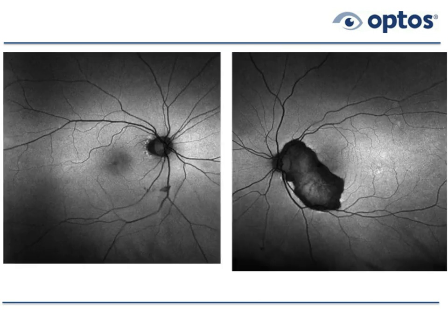Comparing the right and left eye in this image, we're seeing that the right macula doesn't have much going on. There may be some very subtle granularity, some very, very subtle drusen. We can also pick those up on OCT. But the left eye has this large area that was lasered. The tissue was destroyed. It is a blind spot, but the fovea was spared, and the patient still sees well.